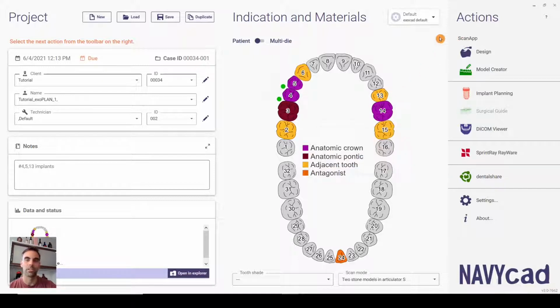crown for starters. What happens is, in the design mode, you get to the very end and you're not able to merge your design parts together. So you're going to design the connection to the tie base or to the implant. You're going to design the screw channel, and at the very end it's not going to give the option to make a part, which is very frustrating, and it's all because it was set up as an anatomic Pontic versus an anatomic crown.